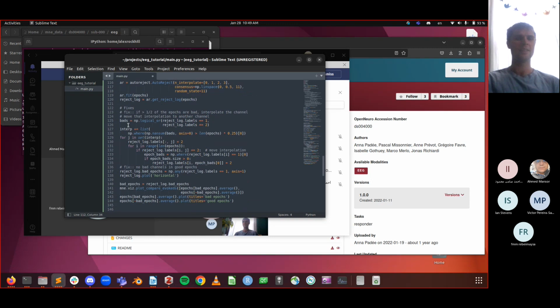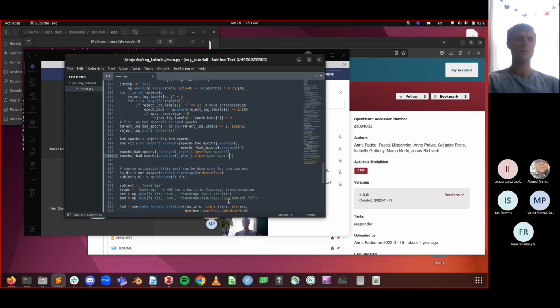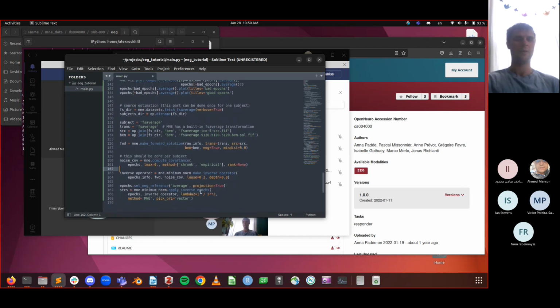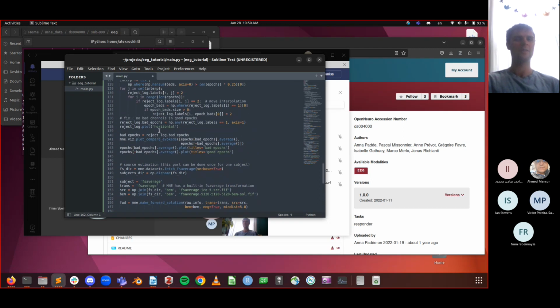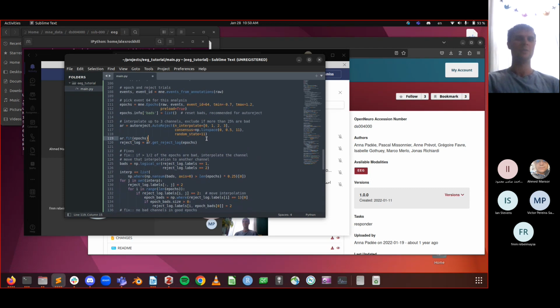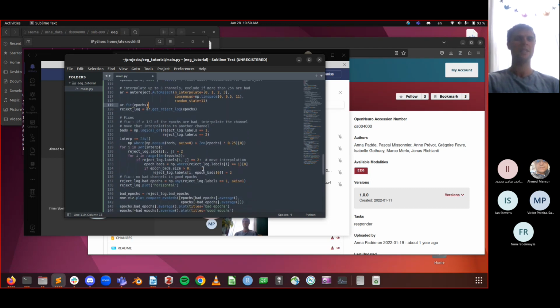And then lastly, I had this fix, but then you're basically done, besides converting to source space as well. I don't want to just keep talking. I feel like this code is something that somebody could walk through, and this would be a good place to start for pre-processing EEG data.